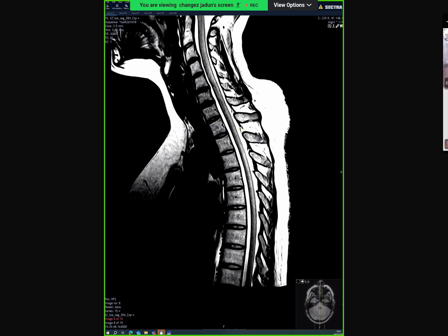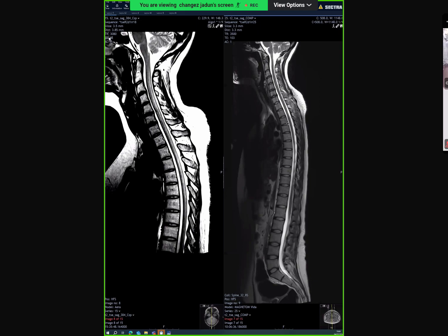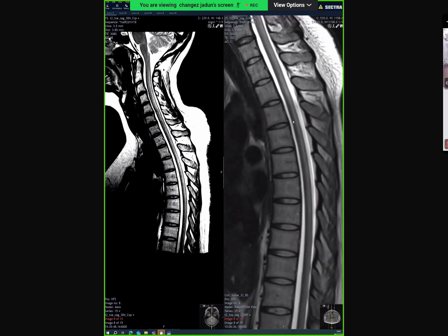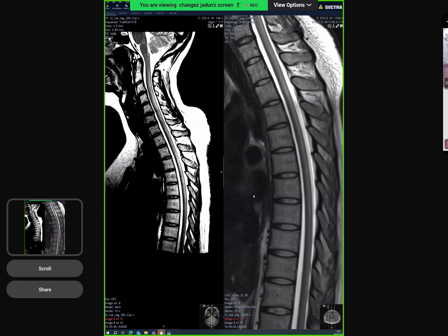It's a diagnostic picture. You don't need post contrast. You only need to get a B12 check. And if you look at the follow-ups, you will see that this has become even more prominent, because initially it was not treated, and when it got treated, you can see it is going more down to the thoracic spine.